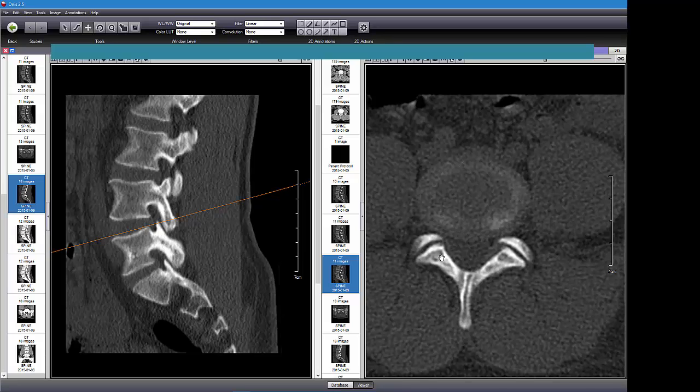You can see this is the L4. You can see the cut going right through the L4 articular process here. Except notice where the cut goes first. It cuts just through the tip here of L5. So there's the tip of L5. That's called the superior articular process. Right and left superior articular processes.